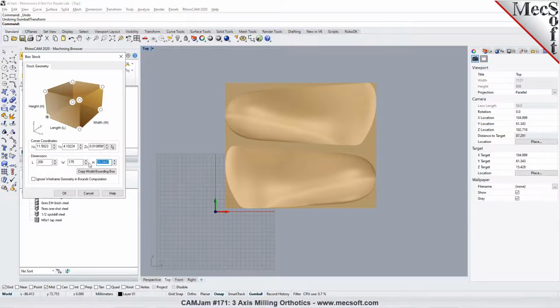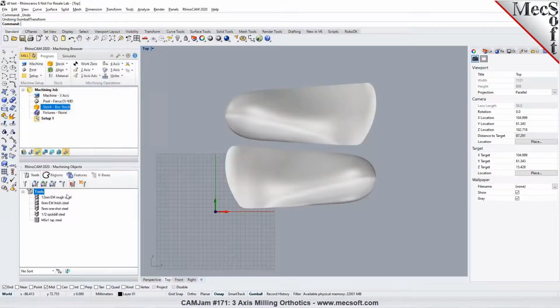It's going to be 35 millimeters or 50 millimeters or whatever that is, right? Standard, or you may have certain size material. So at least we need 30 or 31 millimeters. I'm going to say it's 35 for our demonstration purposes here today. Okay, so we can define the stock in here.